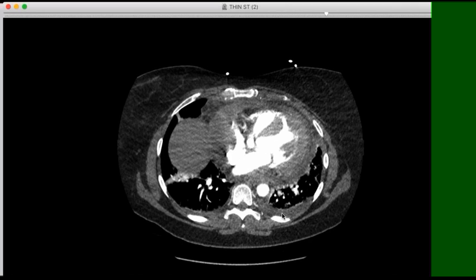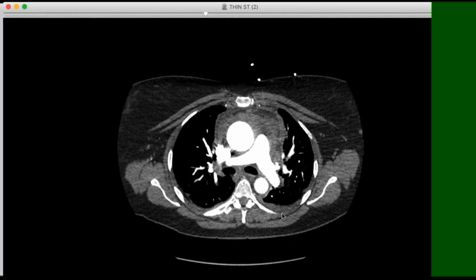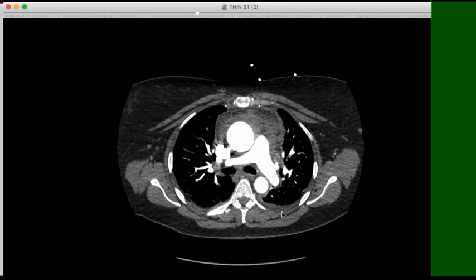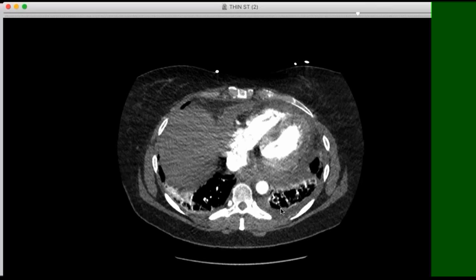So for some reason, I don't know whether there's a big surface of pericardium in the left hemithorax, and anything that's inflamed there spreads the inflammation to the pleura. I mean, it may just be its contiguity that does it. But that's actually held up quite well, and your case is another example. Yes, absolutely. There's a smaller right than left effusion.